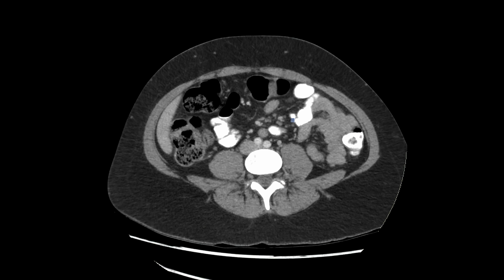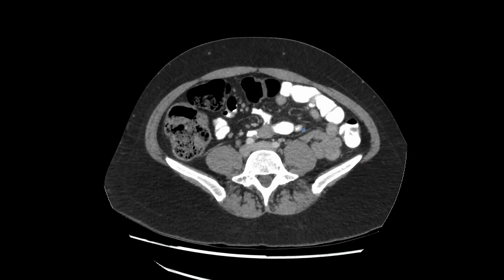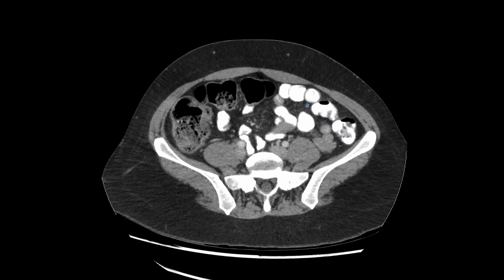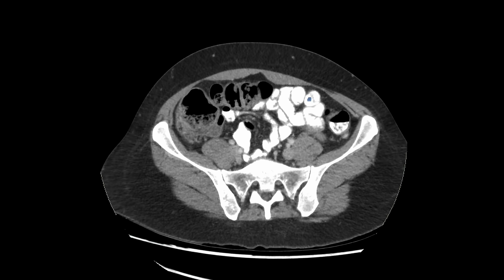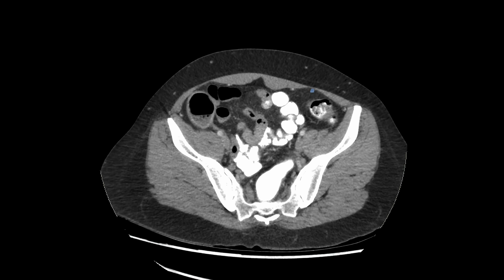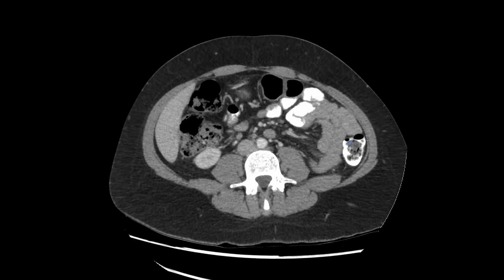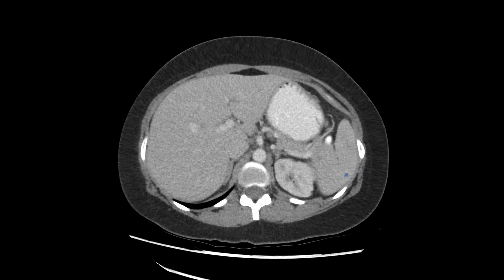This is the small bowel mesentery that we pointed out earlier. And anteriorly, we have the greater omentum, where we see fat attenuation and small vessels. In abnormal cases, like the case we showed earlier, you'll see soft tissue density here or other abnormalities in these peritoneal ligaments. The other piece of basic level peritoneal anatomy that you need to know is some of the peritoneal spaces. And the reason why you need to know this is to be able to describe any abnormalities that you see, as well as know where to look for things when you're looking for things that are abnormal.